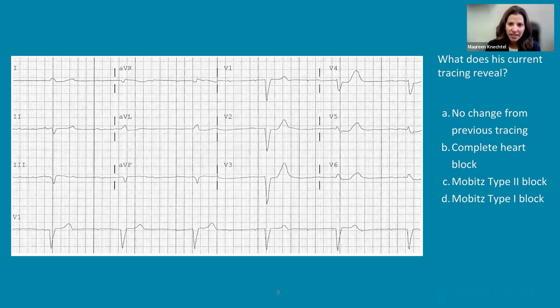That's also helpful clinically because you can have a complete heart block that has faster rates that might be a little bit more stable as opposed to something that's slower, because the lower the focus is coming from in the conduction system, that means everything else above it has failed. So in this case, we can see this is a ventricular escape focus.